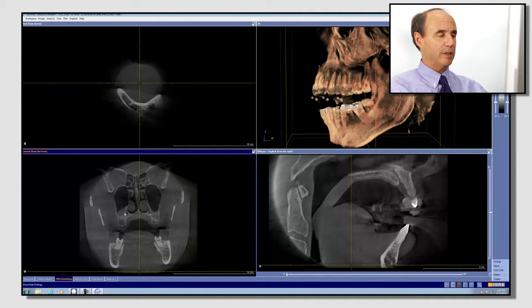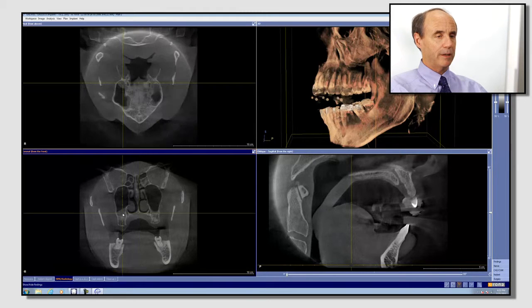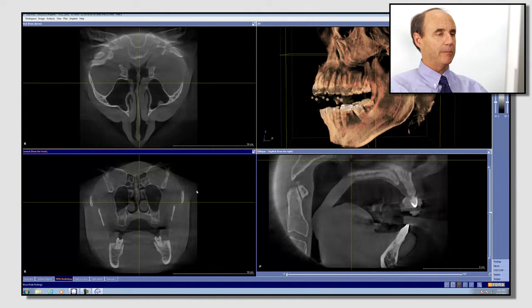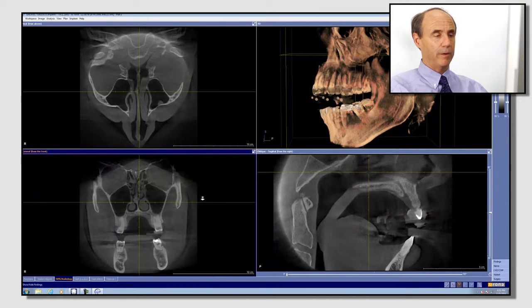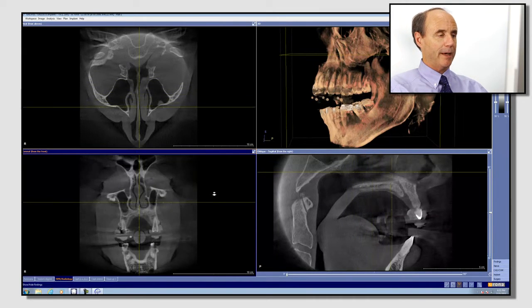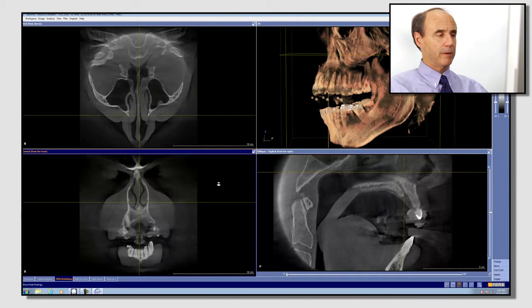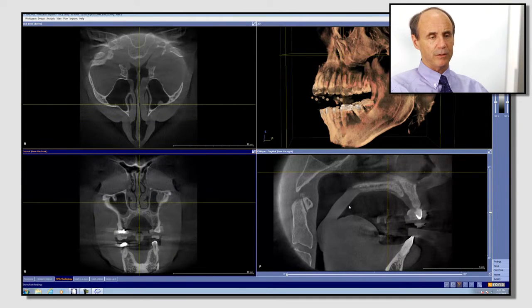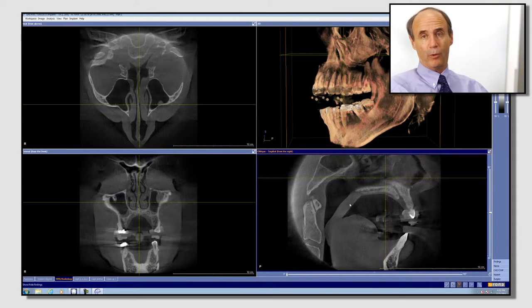Nasal cavity, here we see another sinus thickening. I will double-click, and I see it's just thickened mucosa in the sinus, which is no cause for concern. But I have evaluated this asymmetrical finding in all three dimensions, which is the proper way to view these. Again, I'll return back to the midline and continue moving forward until once again I've gone through the coronal anatomy twice. If I see something unusual, I will then refer to the sagittal anatomy. Since the sagittal anatomy does not have symmetry, a right and a left side, I don't go through that unless I see something unusual.